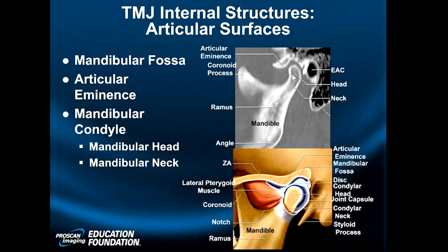The space in which the condyle sits is known as the condylar or mandibular fossa. In front of that sits, on this sagittal CT, the articular eminence. The articular eminence continues forward as the preglenoid plate.